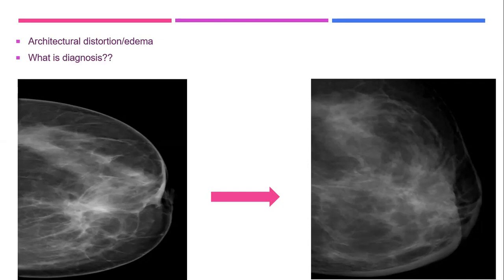So these changes, are they new, progressive, or the same as before? It's not progressive for me on this mammogram. Are you sure? Okay, can you see the skin here? Yes, it's more thickened and more edematous.